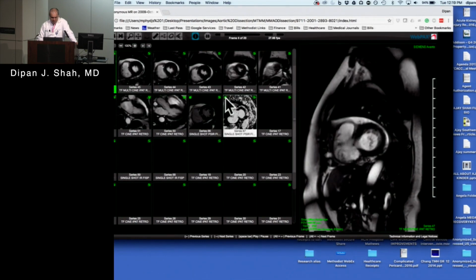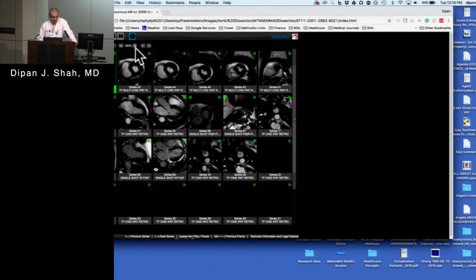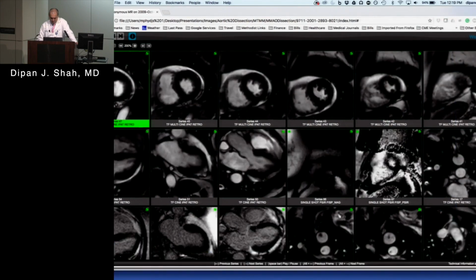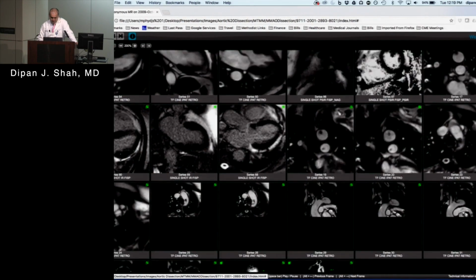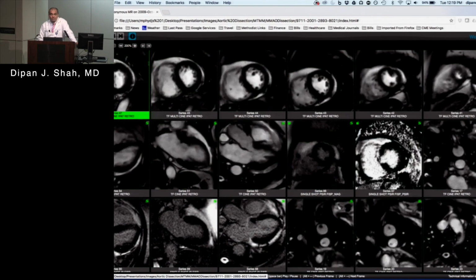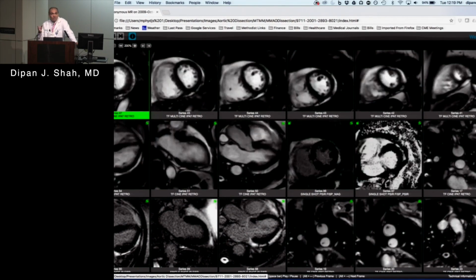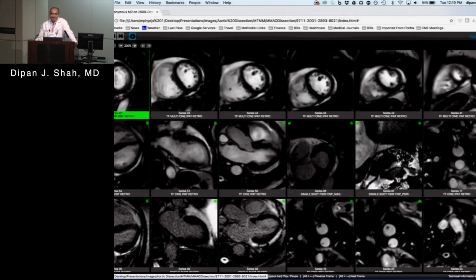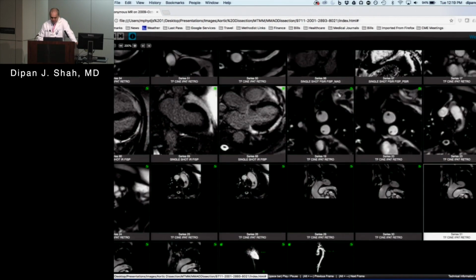Here's the MRI, and let me magnify it here. Dipan, you'll also touch on the fact that if there was a concern for speed, there are sequences Dipan can run where you can get an answer very quickly. You don't need to do the whole 45 minutes. If a patient's coming in with suspected acute dissection, if we find there's involvement of the ascending aorta, then we start out with just an initial set of scout images, and I'll show you what those look like in a second.